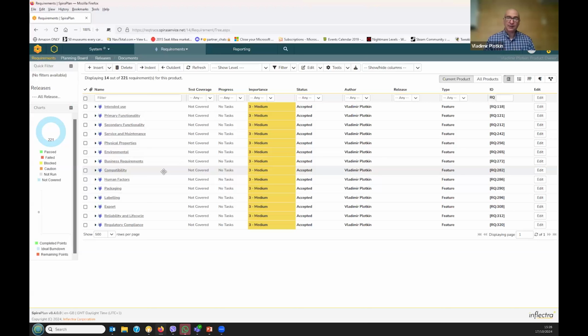When your document master is actually in Word, not in Spira, there will be times when we forget to synchronize those. So I go another way. I'm creating requirements here in Spira, and then I'm just generating a report, and that goes into Word. So it's the other way around.